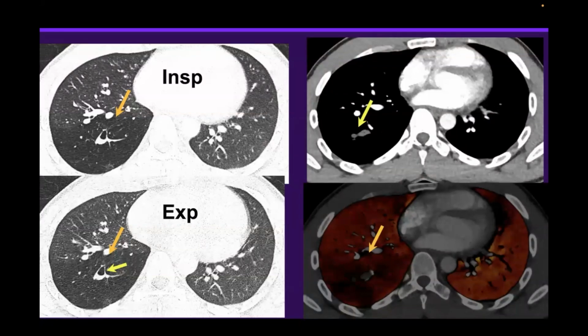Focal bronchiectasis, or one location of bronchiectasis, can be seen with congenital abnormalities, such as in this individual with bronchial atresia. We can see this geographic low attenuation area on inspiratory CT, and this focally dilated bronchus with distal mucoid impaction. This bronchus could not be connected with the central airways, and the low attenuation areas represent mosaic perfusion from air trapping, and notice the small number of vessels and the small caliber of the vessels.